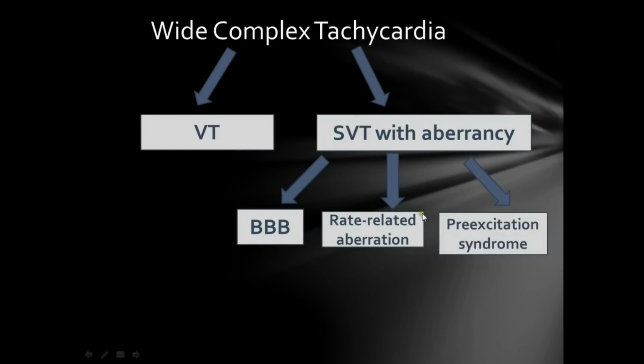Now, these are not all the causes of wide complex tachycardias, but you also have a few other causes, such as ventricular paced rhythm, which is a pacemaker-induced tachycardia, in which you usually have a characteristic ECG finding, the pacing spike.